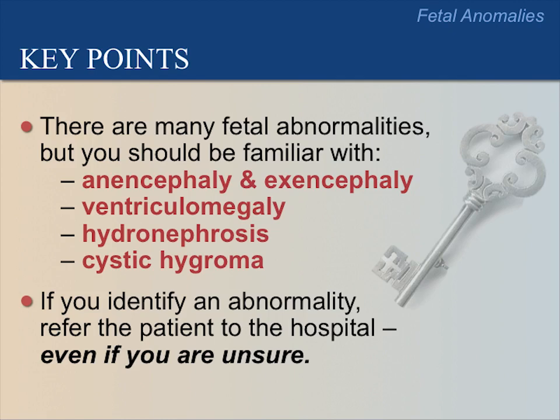Let's review the key points. There are many fetal abnormalities, but you should be familiar with anencephaly and exencephaly, ventriculomegaly, hydronephrosis, and cystic hygroma. If you identify an abnormality, refer the patient to the hospital, even if you are unsure.